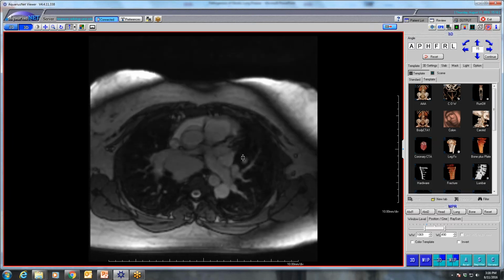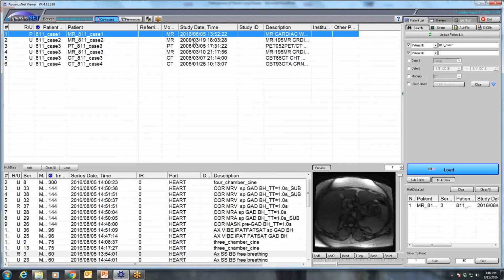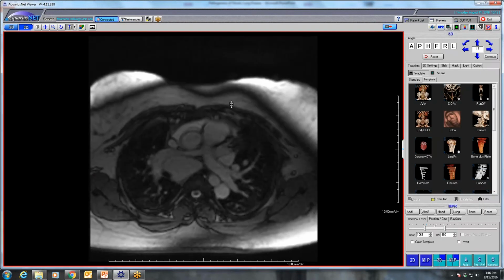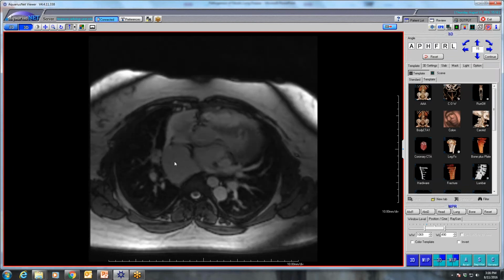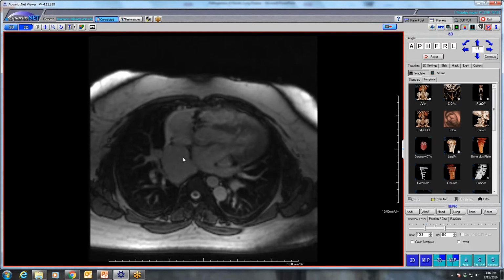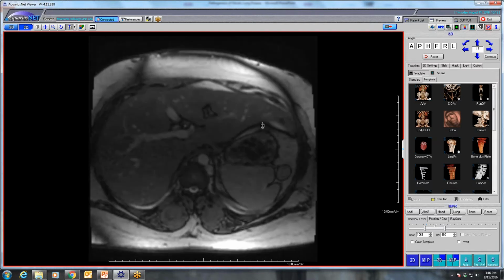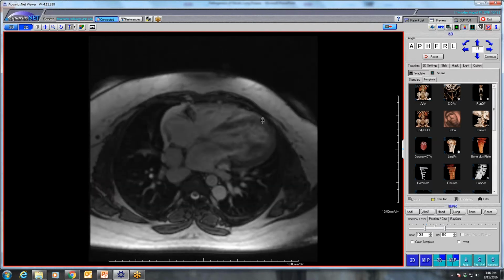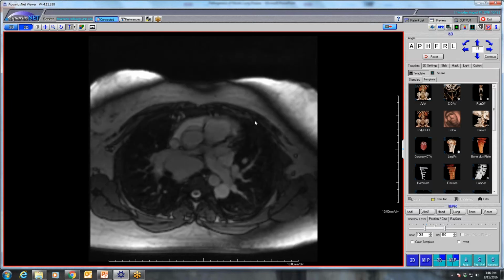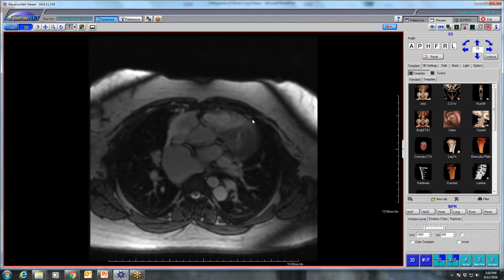And it is subcarinal. It's probably just a simple foregut duplication cyst. You wonder if it's somehow related to the hemiazygous continuation too. The cyst? Yeah, that's what I'm saying. I agree. There's clearly some sort of congenital embryonic anomaly of budding of the venous system, and with that, I wouldn't be surprised if there's some sort of abnormal budding of the tracheobronchial tree that led to a bronchogenic cyst.